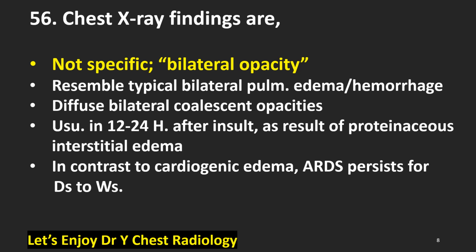Chest X-ray findings of ARDS are non-specific. They were just described as bilateral opacity on chest X-ray at Berlin in 2012. It may resemble typical bilateral pulmonary edema or pulmonary hemorrhage, diffuse bilateral coalescent opacities, usually in 12 to 24 hours after insult as a result of proteinaceous interstitial edema. In contrast to cardiogenic edema, ARDS persists for days to weeks.